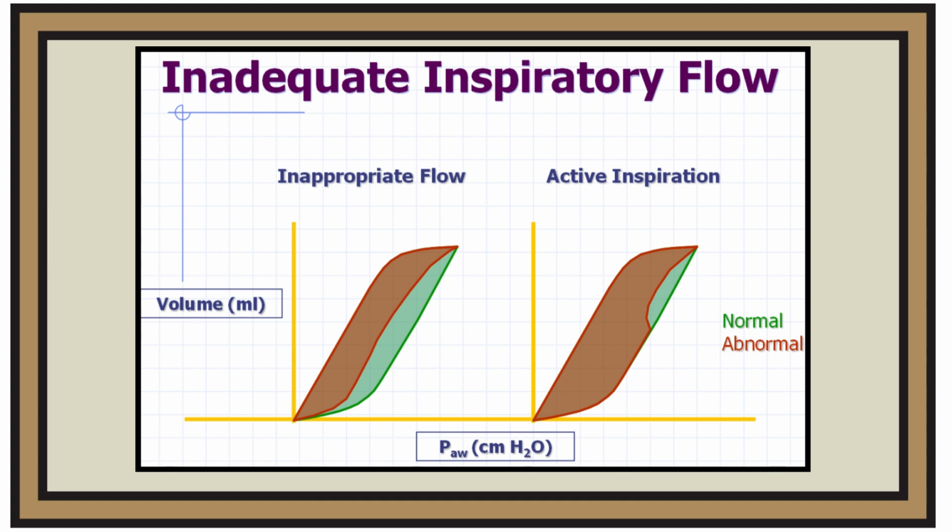Inappropriate inspiratory flow rates are recognized from a scooped out pattern. In some situations, the patient makes inspiratory effort in the middle of the mechanical breath, exhibiting a notch on the respiratory curve. Inappropriate inspiratory flow rates are recognized from the scooped out pattern, as you see in this slide.